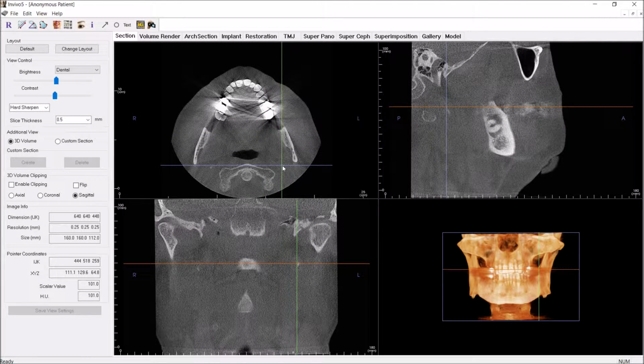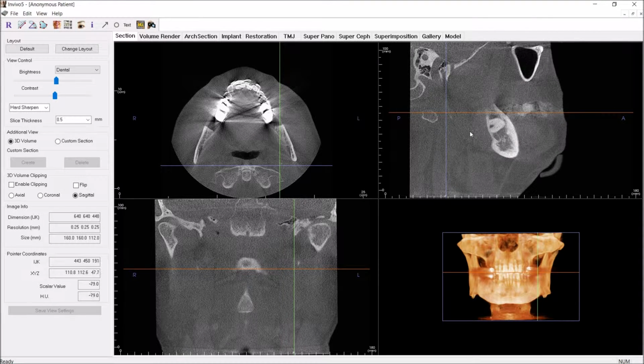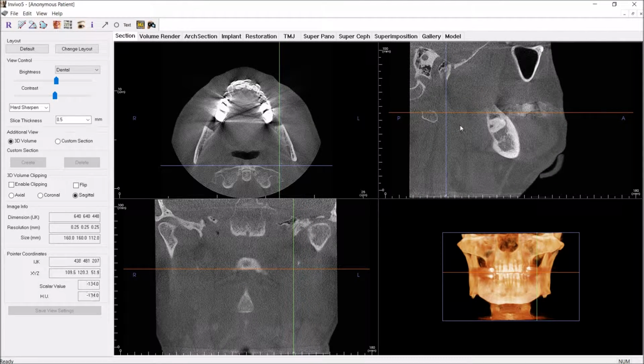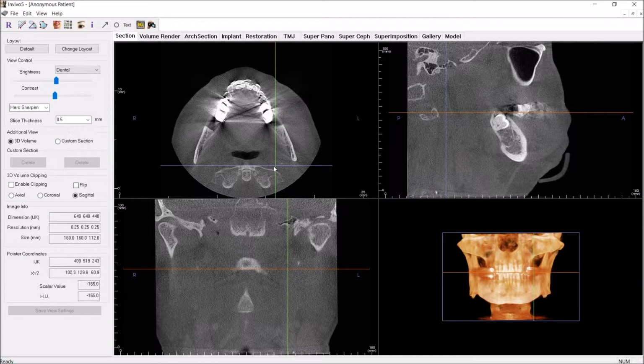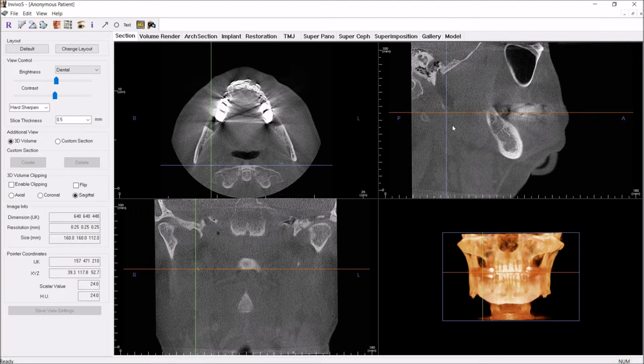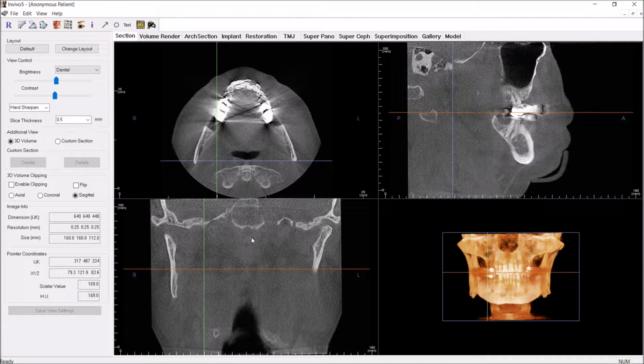We see little dots of calcification in the neck, but especially if you look in the sagittal plane, you can tell just what that is. That's going right to the styloid process. And so all that is a little bit of calcification of the stylohyoid ligament. I get a lot of people that see that and they immediately jump to, oh, they have Eagle syndrome. And I'll just tell you, a good percentage of people have calcification of the stylohyoid ligaments. I would say maybe 30% that I've seen, but I've yet to see a case of actual Eagle syndrome, and that's diagnosed based on symptoms.